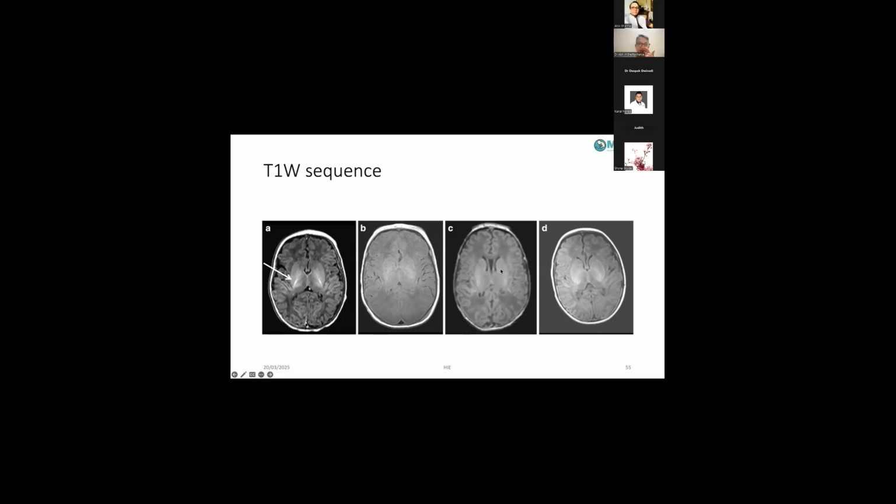In C, you can see the ventricles are all right. You can see the cavum as well, but yet the intensity has gone down for the PLIC, right? Everyone agrees? So the edema is not that bad, but the hit has been taken by the internal capsule, so the brightness has gone down. This is again kind of a fuzzy brain kind of an image. No PLIC. You cannot see the posterior limb of the internal capsule. Again, not massive edema. It's just the PLIC has taken the hit. Agrees?